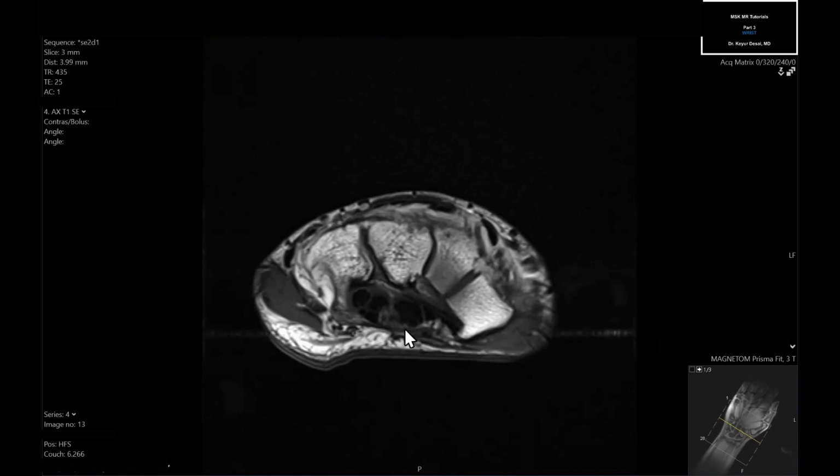If you imagine you draw a line across from here, and then you have bowing of the retinaculum, you're going to draw another line down, and you're going to measure the degree of displacement of that flexor retinaculum to suggest whether there is carpal tunnel syndrome or not.